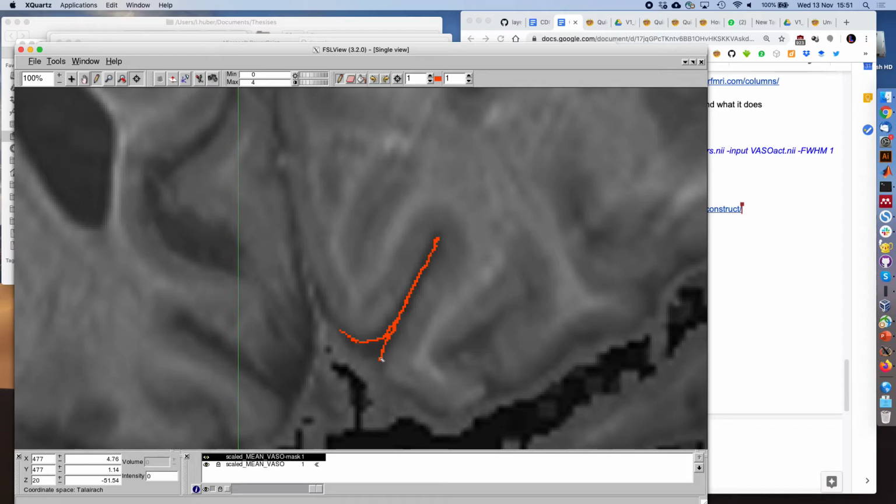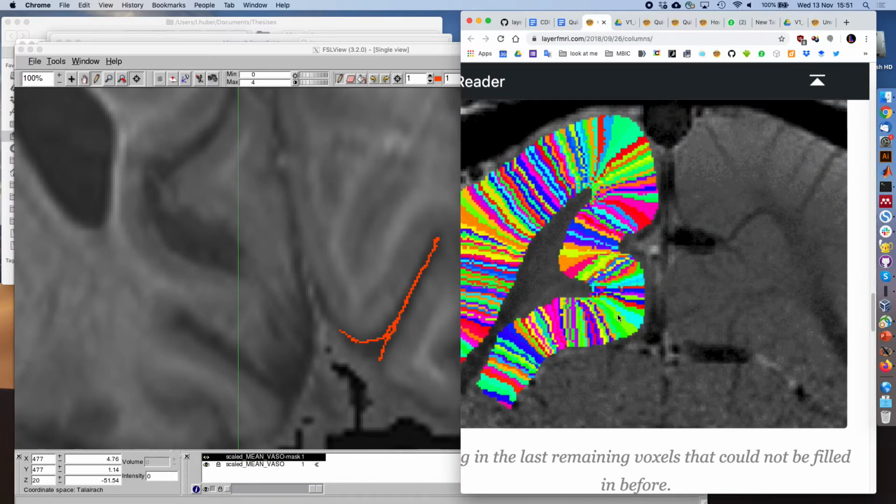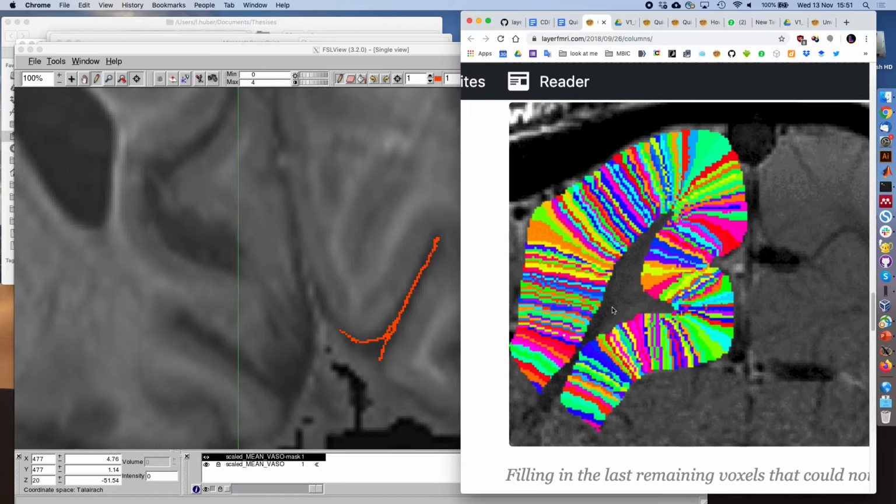the first layer that we have, this is not the layer, this is kind of the CSF layer. Yeah, this is outside gray matter. So if you want to look at gray matter only, you cannot use the superficial one. The superficial and deepest layer, like layer 0 and layer max, is weird, which I didn't talk about here. Here I usually treat them differently, the outermost ones. And for the coordinate system in topography, if you have them connected, you're screwed, right? Yeah. All right, you're right.